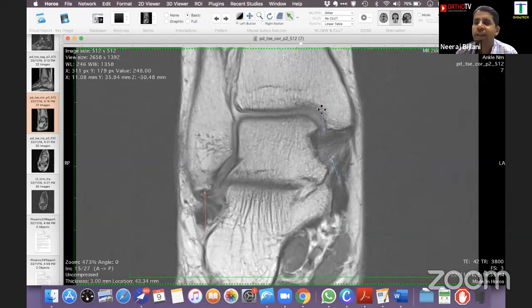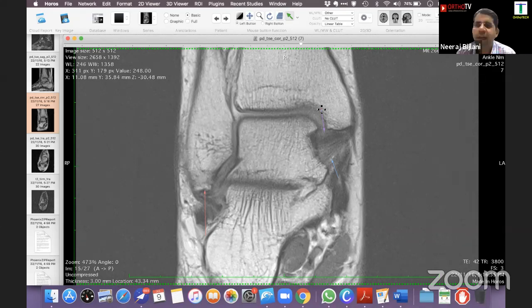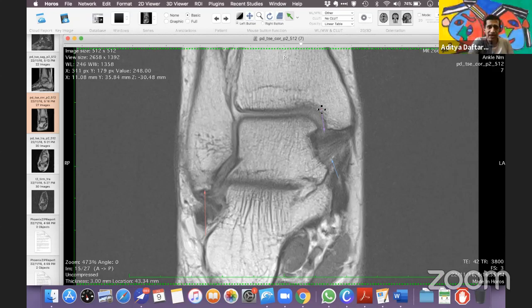The ligament injury was 10 years old and she's saying, "मैं 10 साल से pain बर्दाश्त कर रही हूँ, मुझे आदत पड़ गई." So fair enough. She may even do well. If you look at the subcutaneous fat on her, she doesn't look like a very heavy set person. Yeah, she's very thin. She probably has an element of flat foot. It looks a little bit angulated like this. So she may be somebody who's helped a lot along the way.